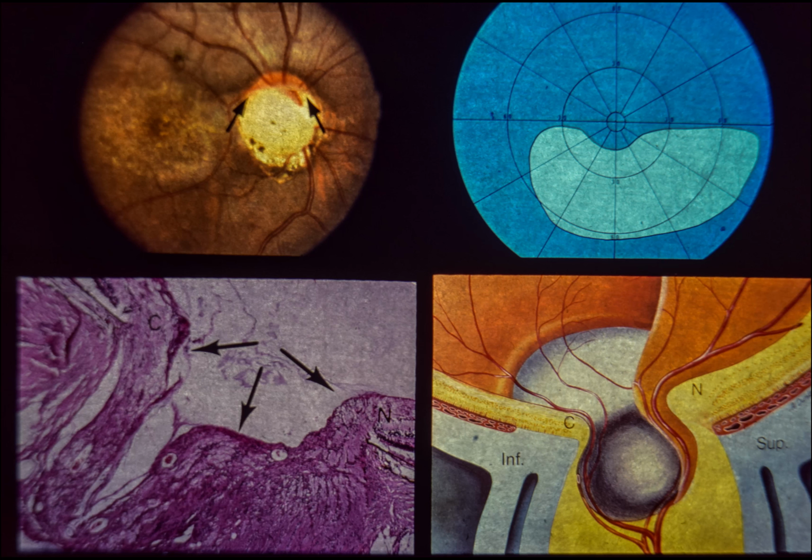The coloboma is one of the common malformations of the optic disc. It is a large excavation that occurs when there is abnormal closure of the fetal fissure. In most cases, optic disc colobomas are isolated phenomena, not associated with other central nervous system abnormalities. They are, however, almost always associated with decreased visual acuity and an abnormal visual field.